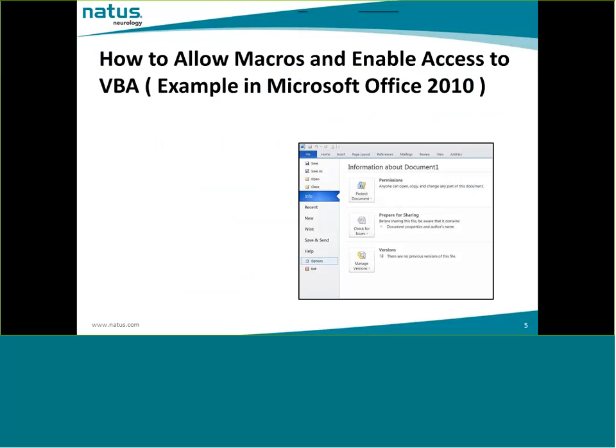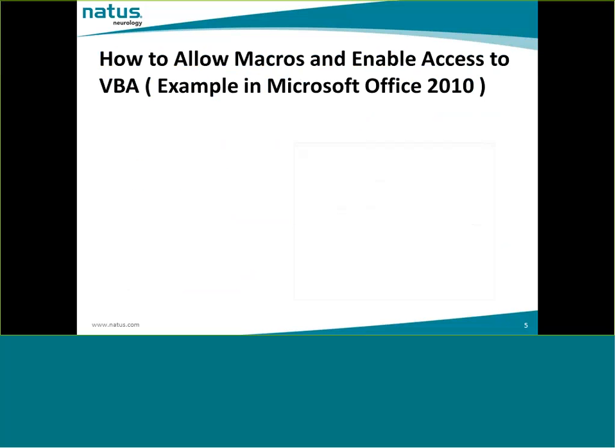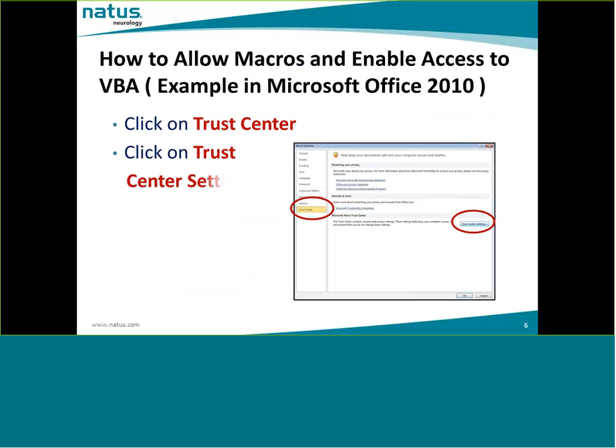So first you open Microsoft Word, and then you click on File, and then click on Options. Next, click on Trust Center and click on Trust Center Settings. Please note that the example that I'm showing here is actually on Microsoft Office 2010.